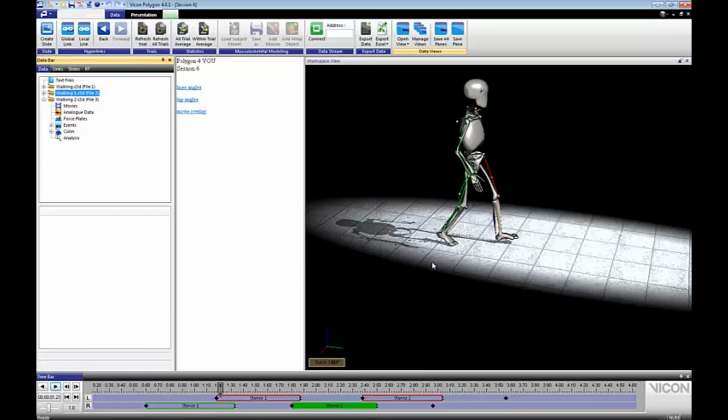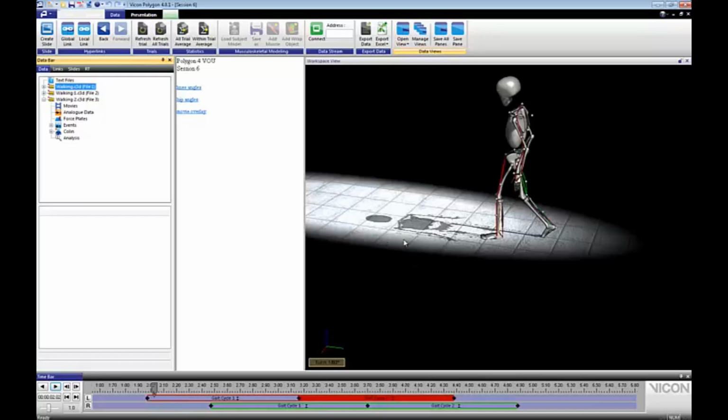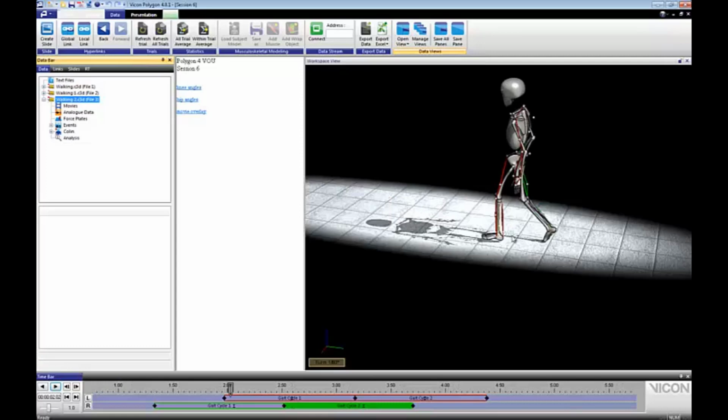And you can see he's walking in the opposite direction. So I can also do this one, and it should switch directions on me again for the opposite direction. So you can see the variations in position are accounted for by how far they are into the normalization scheme. So in the very beginning of the gait cycle, he is in different spots for the different trials. So that's why it moves a little bit.